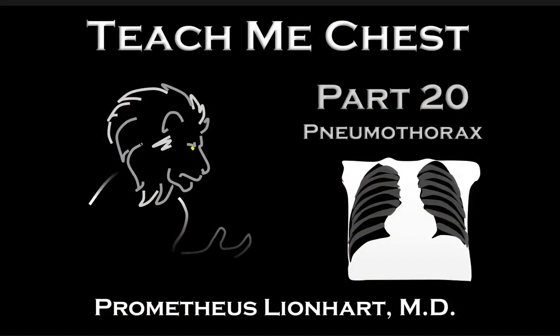Alright, so back again here with our 20th lecture in our series on the chest radiograph. This is going to be a lecture on the pneumothorax, a topic that we've mentioned multiple times sort of in passing over the last series of lectures, and now we're going to go ahead and explore this pathology in more depth.